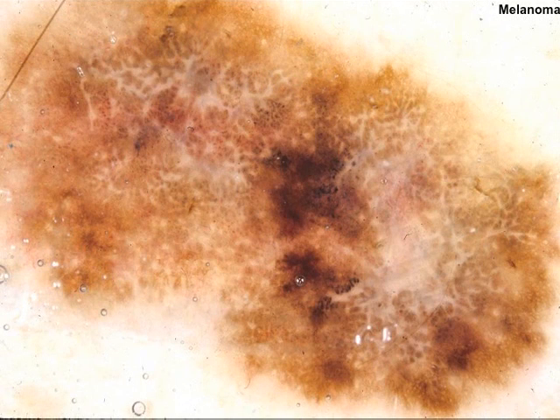Notice the hypopigmented lines running serpiginously around these elongated, curvilinear, globular structures. Globules we usually think of are round to oval, right? Here the shapes are not round to oval. And that's your most blatant negative network.